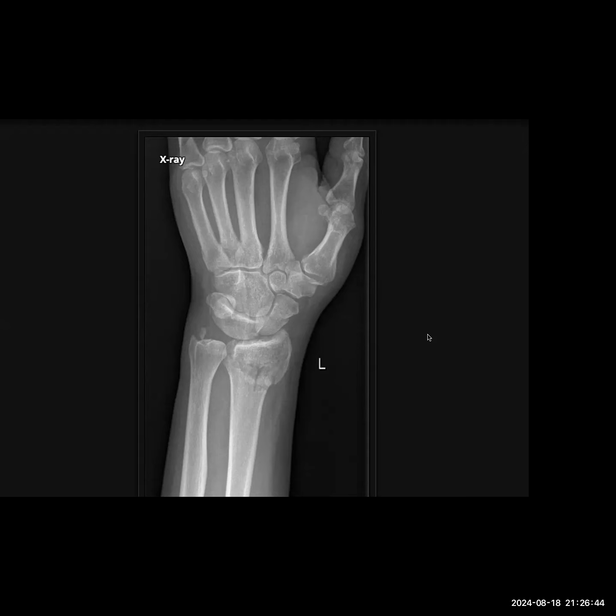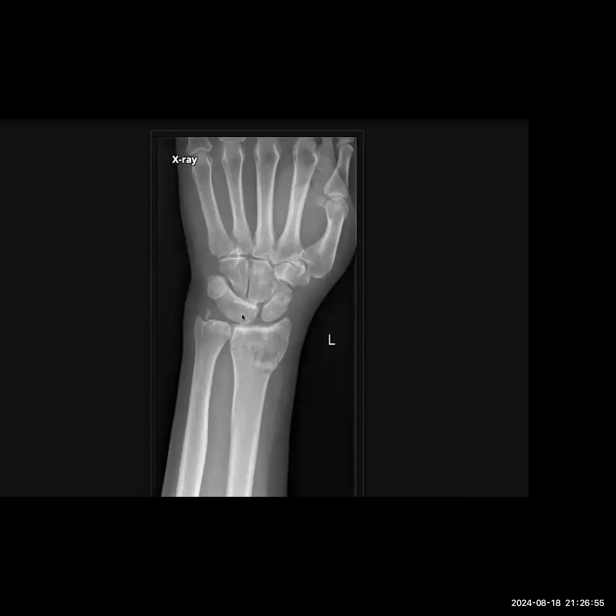So you just give out the fracture and then the pain might still persist a couple of months later. So please look at the bones. I think in the oblique view, even in the frontal view, it was quite apparently seen, isn't it? Apparently. Yeah. So that's fine. As long as you picked up the major surgical emergencies, you would pass this case. But if you were to push for a 7, I would recommend that you pick such findings as well.